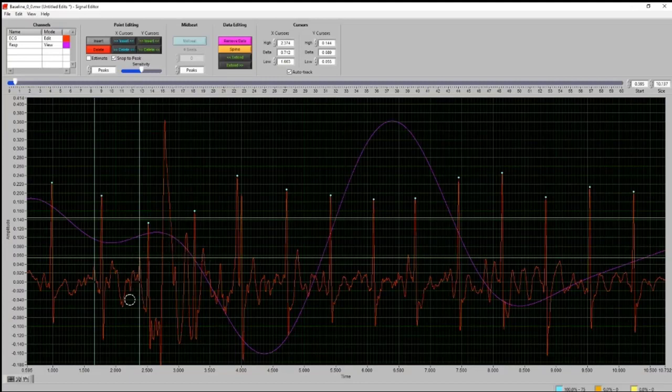So we're likely moving through and causing that artifact here. In this case, we could certainly pick the second one, but we are really getting into a guessing game of which is the actual peak, and we want to stay away from that. It may not have a huge effect in the RSA. It may, but it's also certainly going to cause issues within multiple raters.